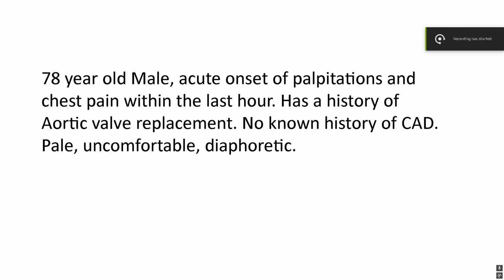Okay, here we go. I'm going to be talking about some interesting EKG cases I had this last week. Both of these cases just happen to be about wide complex tachycardia.